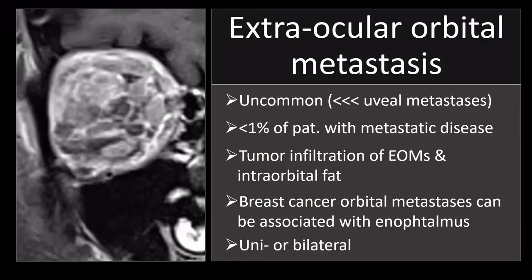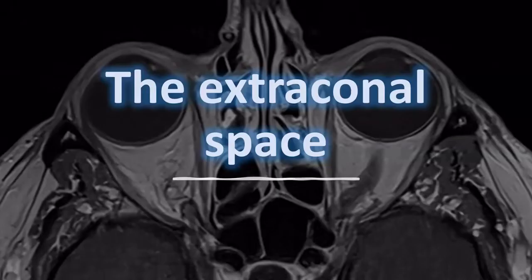An intraorbital lymphoma can also give a similar appearance, although intraorbital lymphomas, which can also be seen in all orbital compartments, tend to be more mass forming. This concludes my presentation on the intraconal space. Stay tuned for the extraconal space in the next presentation.